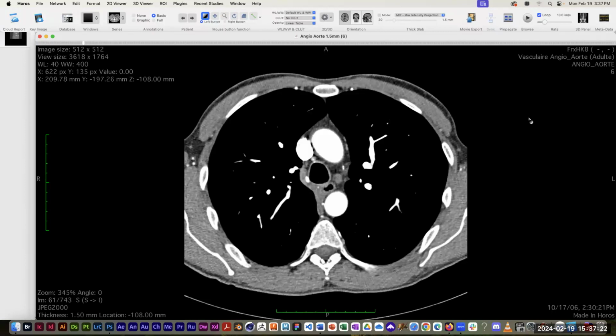And I'm going to show you the coolest way to create an ROI. The downside to this last method is that it's super fast and kind of automated, but it only works with objects that have really high contrast from their neighbors. So I'm going to use this to create a region of interest of the lungs, because the lungs are solid black and they're surrounded by a lot of other tissues that are white and gray. So it's going to be relatively easy for me to segment the lungs out from their surroundings and do it in a way that's basically automated.